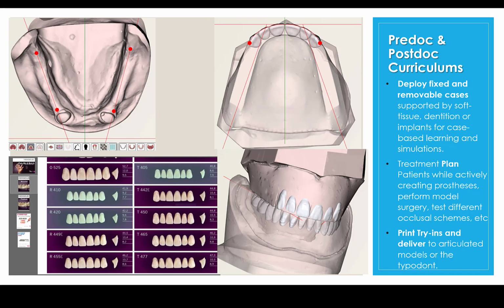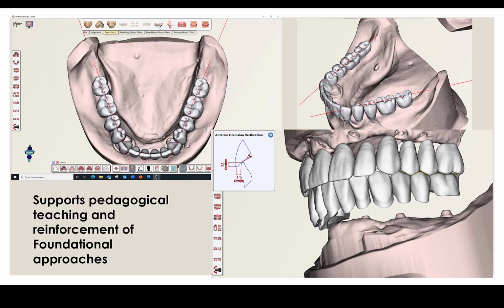Anterior tooth setting is performed in the same way on the virtual articulator, where catalogs highlight the teeth that would fit within the region you delineate, and the posterior teeth are set according to where you want the central fossae of the mandibular teeth. You can independently move the teeth, mirror position changes to the other side, and otherwise customize the setup at any time. If you do not like the teeth you selected, you can go right back into the catalog and pick out a different size, even if it is outside the suggestions of your original boundaries.